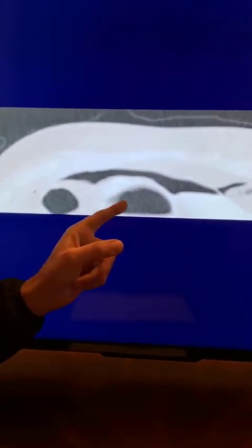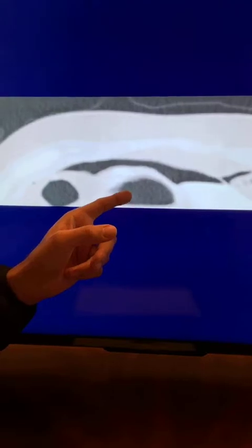If you had it in the abdomen window and it was not a good day for you, you'd blow by this in a second and you'd be like, no, he's good to go, send him home. If anything, and I'm going to get to this when we're talking about PEs one day, because that's a windowing issue as well, but when you're checking for free air on CT, look at the lung window.